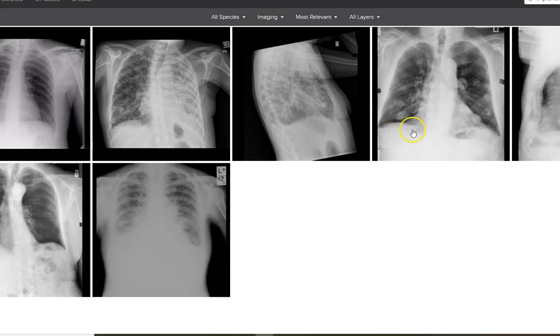The other thing that we don't do aggressive physio on is lung cancer. So here we have this sort of classic picture really. If you've got any sort of organised ball somewhere in the lungs that it shouldn't be, then be suspicious. It doesn't necessarily mean, you know, we don't know.